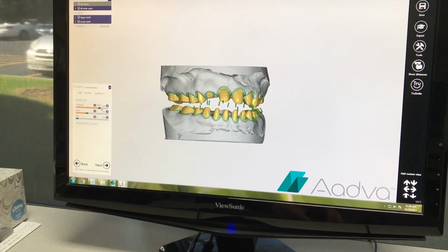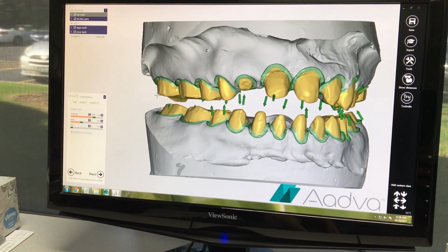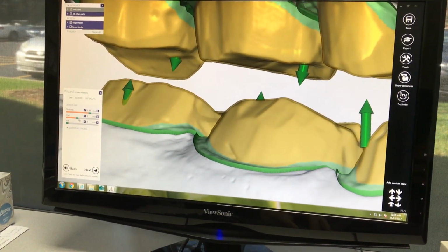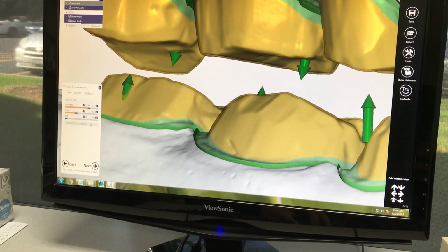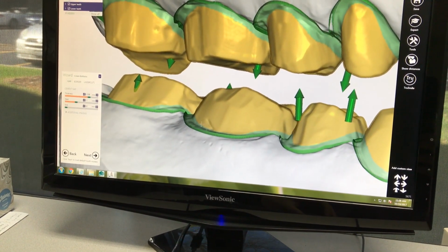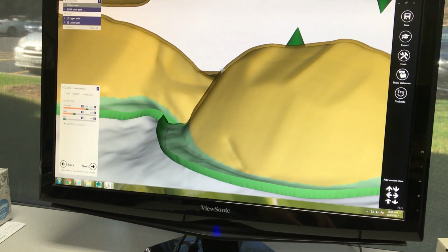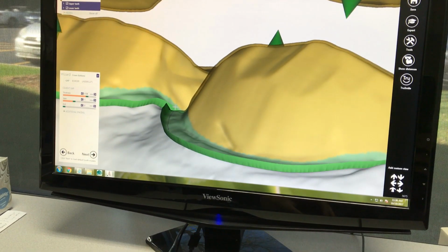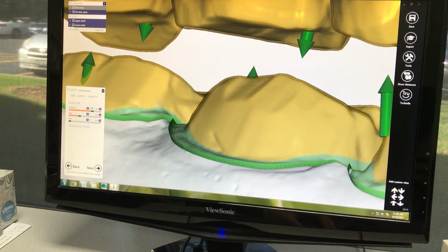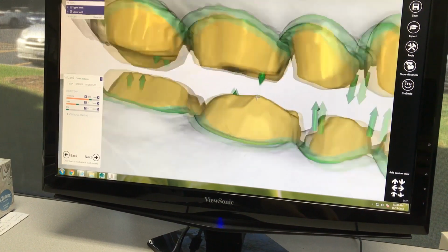So on the sidebar here, we got the gap, which gives us the thickness of the preparations. Can you show us the start, Nora? This is the start. Basically there's not going to be any spacer there. No space? Okay, so to have a nice fit, but then after the start, that's where we get 0.08 thickness. So that's where the cement would go, except that it's not going to be cement. We're just going to wax things up here.